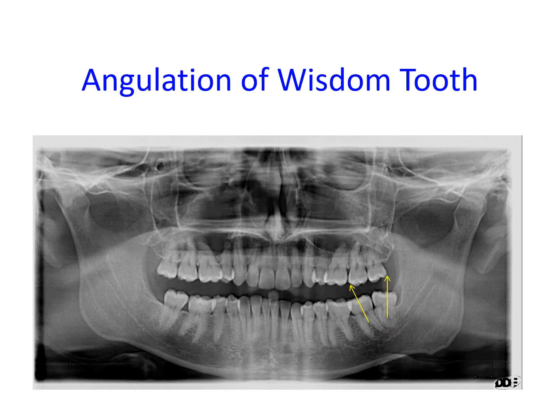that the two lines drawn through the furcation are divergent, which means that the impacted wisdom tooth is distoangular. Without this objective assessment, one may be deceived in believing that the wisdom tooth is actually vertical, whereas in reality it has a distoangular position.